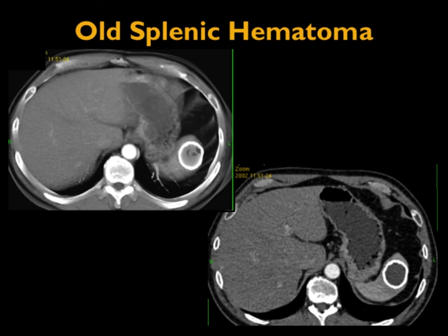Now, sometimes you see splenic lesions which are cystic and are calcified, like this case. When you have a dense calcified rim, you know it's benign. It's a leave-alone lesion. Most commonly, it's due to prior bleed with calcification in the wall. Old infection theoretically can calcify, but that would be pretty rare. When you see very dense calcifications, 360 degrees, you've got to be thinking about old hematomas.